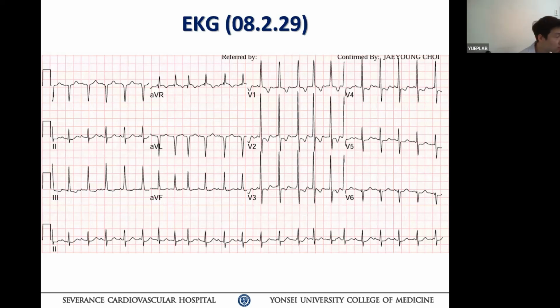If it is a pediatric patient, I would think of junctional ectopic tachycardia because there's dissociation of A and V. You mean JET? Yes. Or AT. So which do these findings favor, JET?